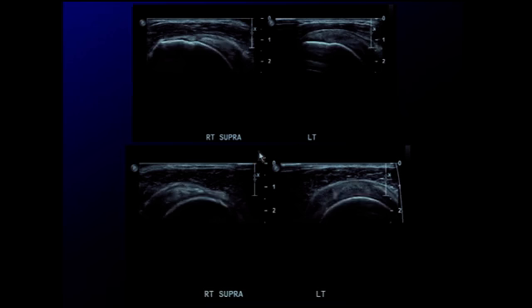One more example showing abnormal on this side, the right side, and normal on the left side. This patient presented with acute shoulder pain, long axis view on top. Here we have the rotator cuff with a defect, overlying deltoid, and then the rotator cuff that's normal, extending all the way across the humeral head and inserting onto the greater tuberosity. Short axis view, the supraspinatus is missing, the infraspinatus remains. Here is what it looks like on the normal intact side, where we see a complete cuff covering the humeral head.